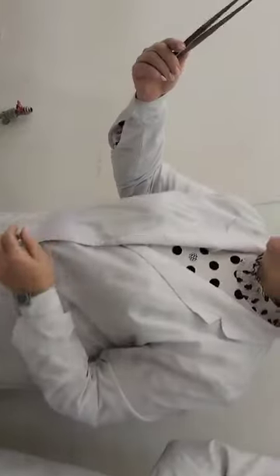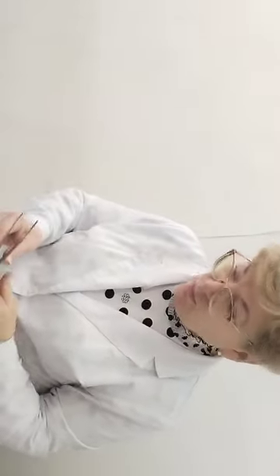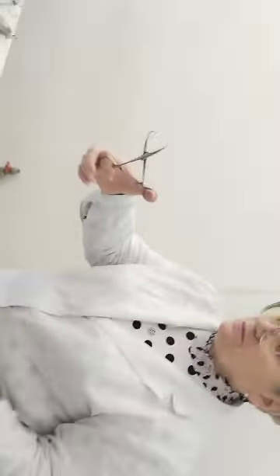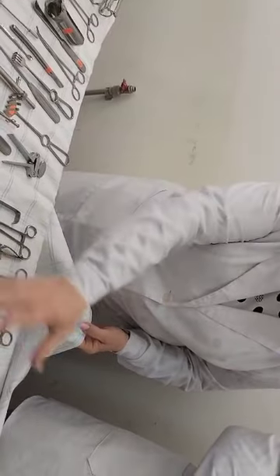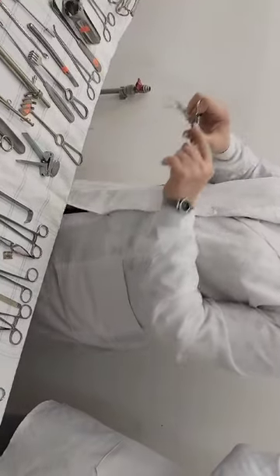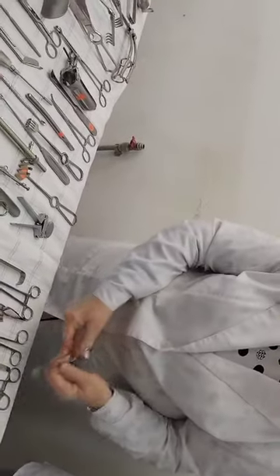And this forceps, anatomical forceps, with little groove, and surgical with hooks. These forceps are for the tissue, how this is fixated, and turn the tissue on the operation place. This is old. This place has the name cremaliera. Cremaliera. Close.